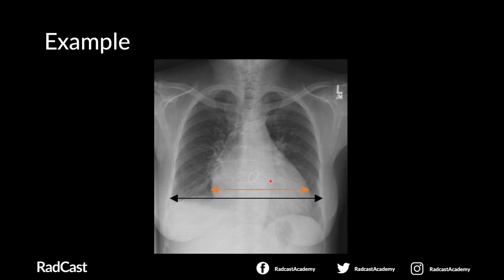This represents a previous mitral valve repair. Here you may notice some wires. These are sternotomy wires indicating previous chest surgery. So overall, this chest radiograph is in keeping with cardiomegaly in a patient who's had previous mitral valve repair.